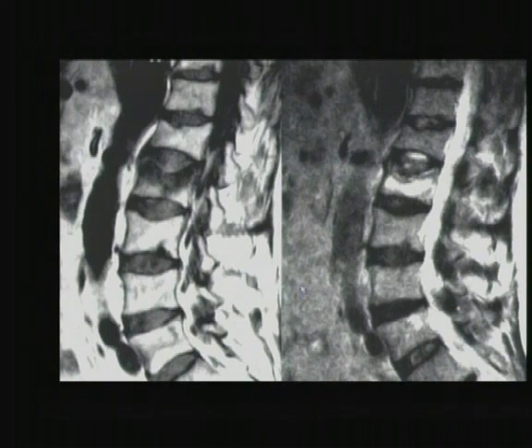So if you look at the compression fracture, let's say like this, it's obviously benign because the marrow is normal. How about this? The marrow is abnormal here, but this band pattern is considered to be benign, especially since part of the vertebra still has normal marrow within it. This is a typical benign collapse. How about this? There are some dark signals here, but part of the vertebra is normal. This is another sign that it is benign. So unless the whole vertebra is involved, don't think of malignant.